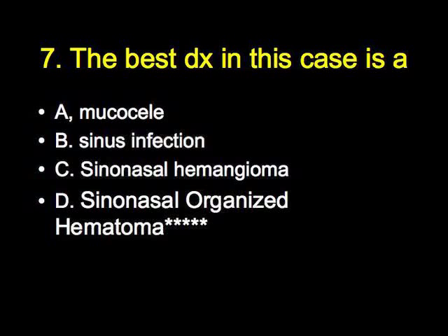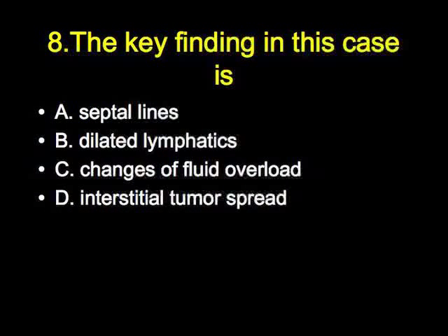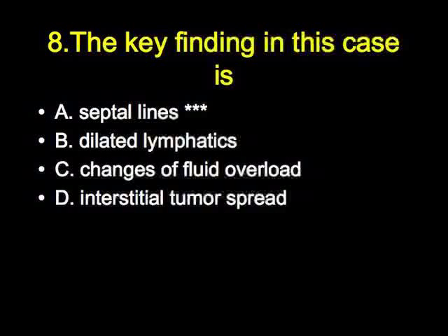And then the next case, I gave this one to Eric Stern and Ella Cazzaruni. Prominent septal lines, you go through failure, you go through a number of different things. But then I also showed pleural thickening, which you can kind of see posteriorly. And this is a wonderful case via Dave Nadich and Philippe Grenier. This is a case of Erdheim-Chester disease. The key thing, of course, I didn't give you the diagnosis, but the prominent septal lines. But this was Erdheim-Chester disease, and I got those guys on this one as well.